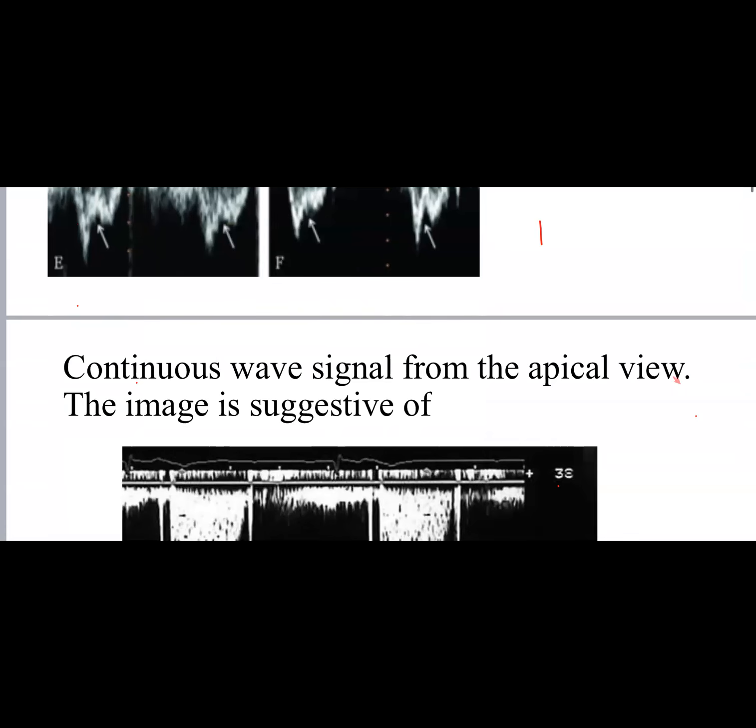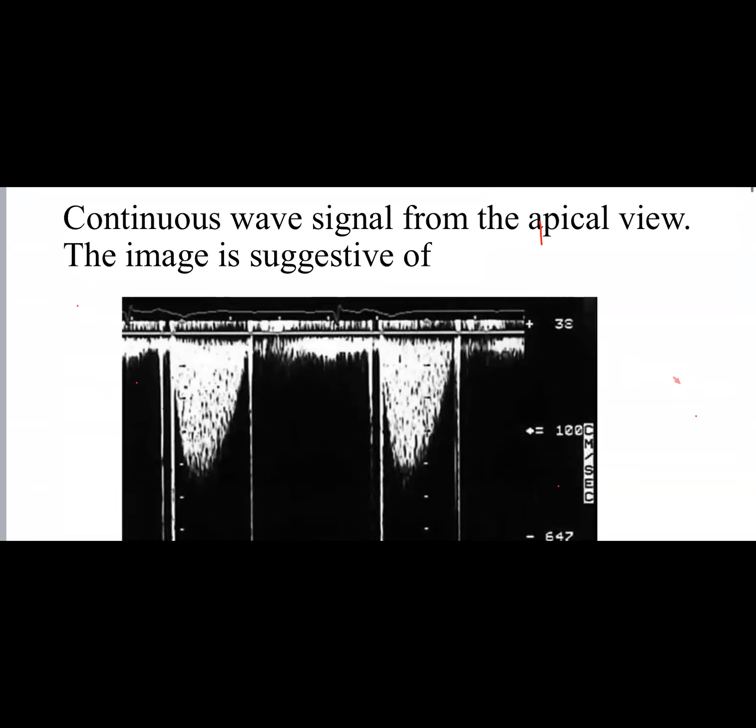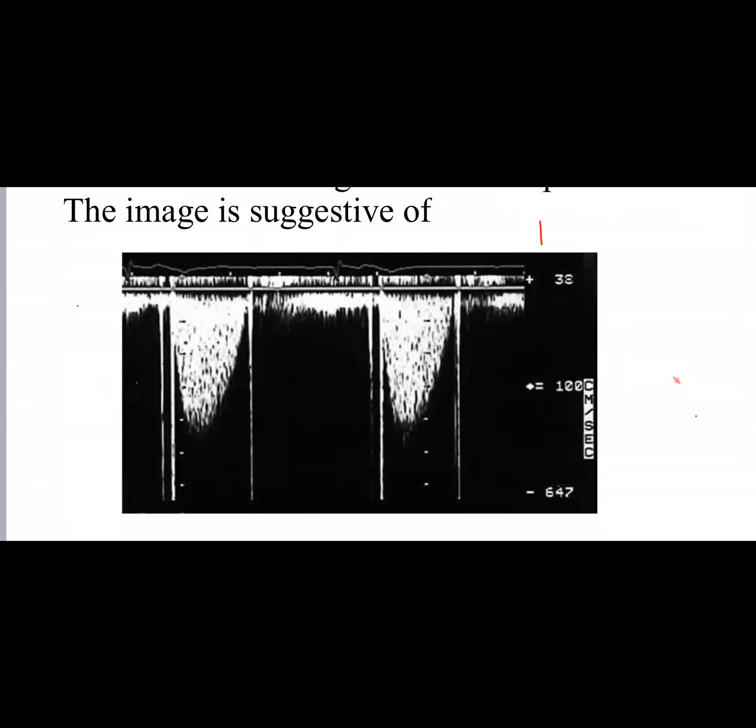Okay. Thank you. I need a better, intelligent guess. This is really tough. I used to show it to our fellows, and most of the time nobody is getting it right because seemingly it needs sort of visual hallucination. So what do you think about this one?